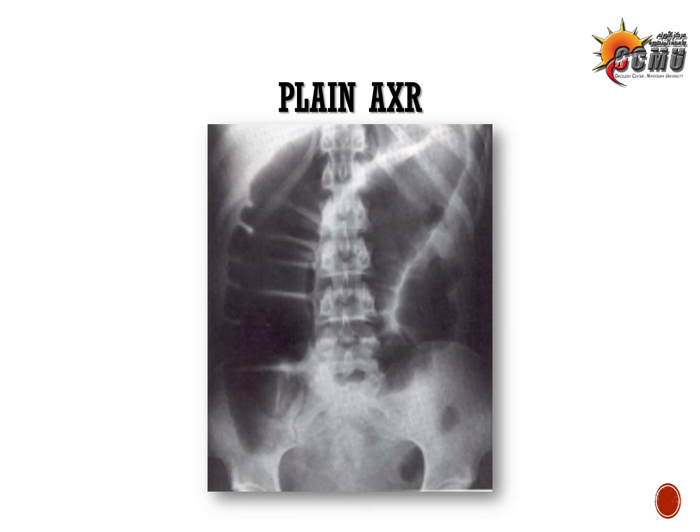Okay, again, this is a plain X-ray of the abdomen showing parts of the abdomen and the pelvis. It shows abnormally dilated bowel. Usually, this is the large bowel, denoted by the abnormal gas shadows within this bowel, and usually this is the sigmoid that's dilated from the pelvis up into the upper abdomen.